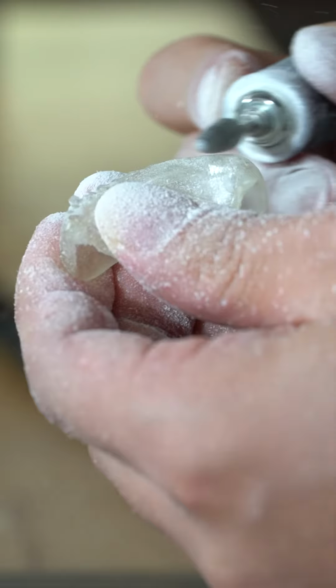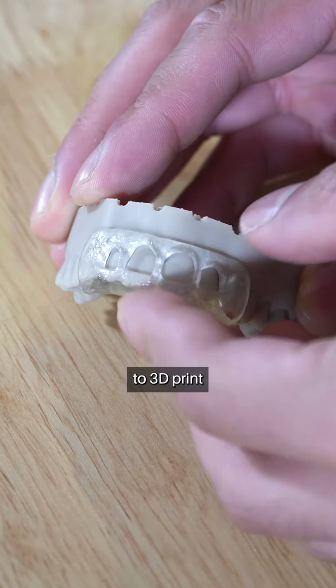And there you go, an easy way to 3D print gingival reduction.